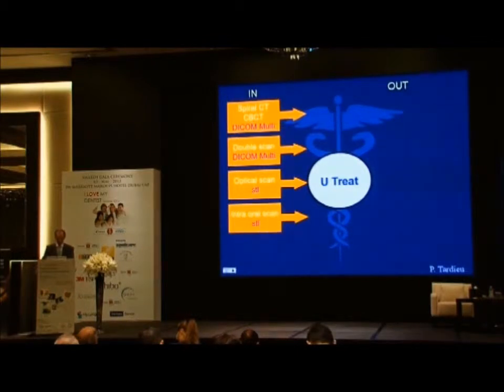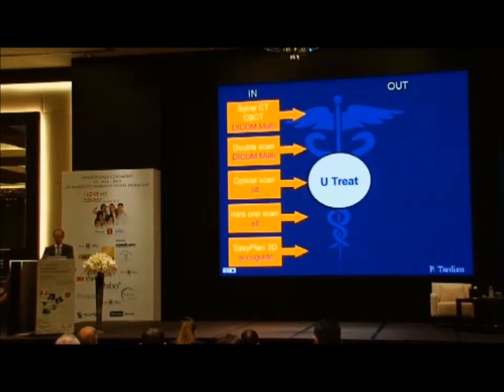The new development is the intraoral scanners. So I am going to show you how I have been using an intraoral scanner, and I have been designing the jaw image, and I have been overlaying this jaw image over the CT scan. This is the highest development today that we can have in this technology, and I'm going to show you a case with that. And also, we keep the proprietary format, so that you can go backwards and forwards in the same program, so no need to start from scratch again if you forget to treat fully the image and you need to do it later in the program.